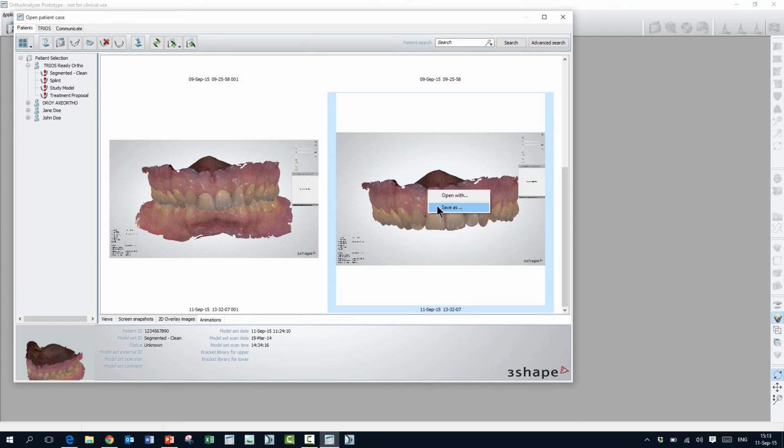The final thing I want to show you is how you control the length of the animation file. The Ortho System ships with an animation length of 10 seconds, no matter how many steps you have in an animation file. I'll show you where you can change it, and you probably guessed it's in the control panel. Let me just open that right now.